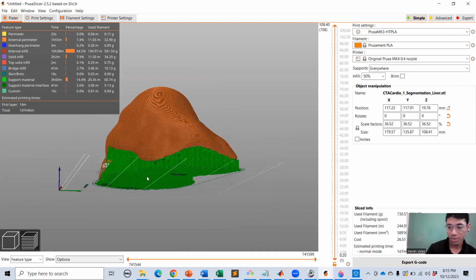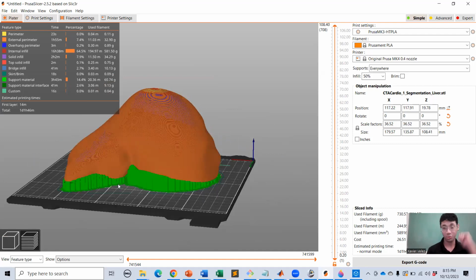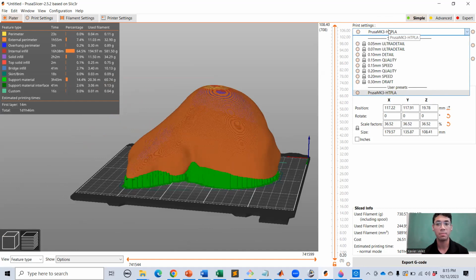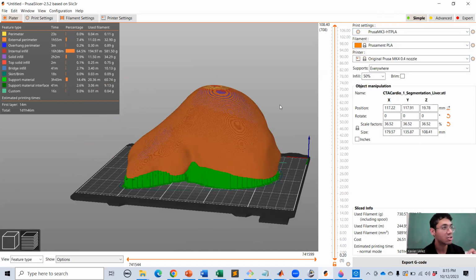One more thing, I'm not going to go over this too much because if we ever do a 3D printer workshop, that might be more so for that. But the actual print settings are a pretty important part of this as well. Just like part of the G code when you export it is not just the layer specifications, but also the printer specifications when it comes to speed and quality. Like you guys can see the speed and quality, and how thick each layer is when it gets printed. All of those things are going to be incorporated into the print settings.